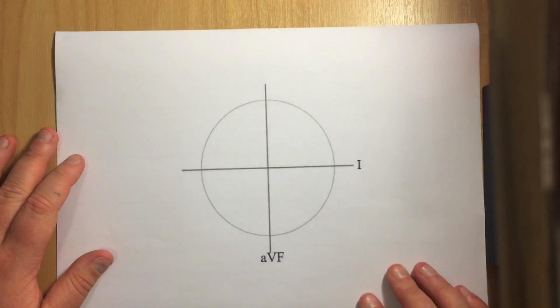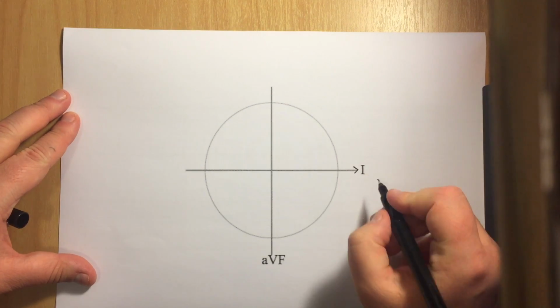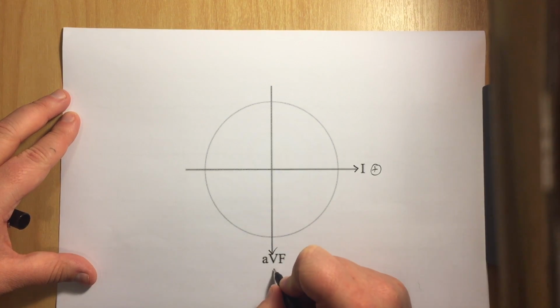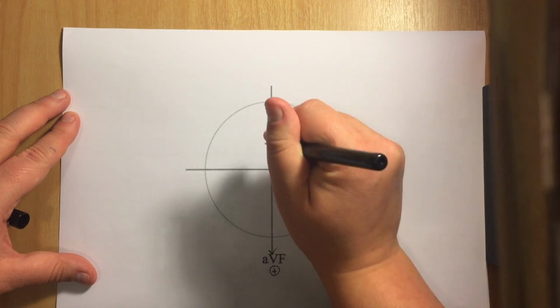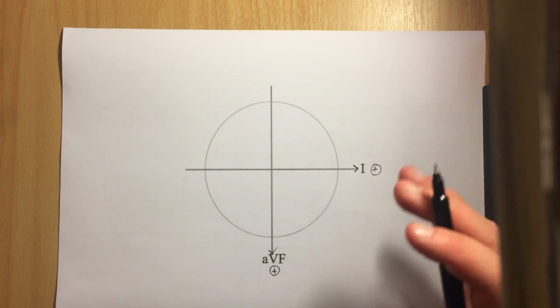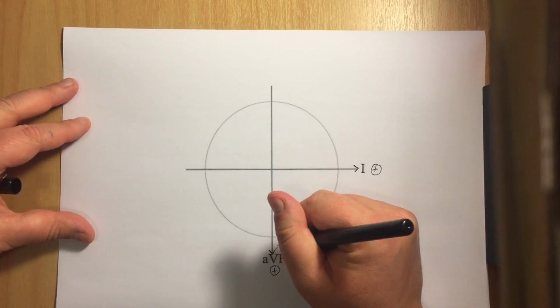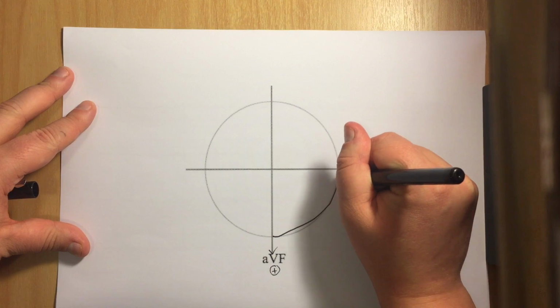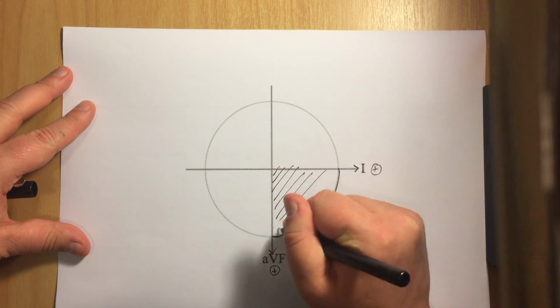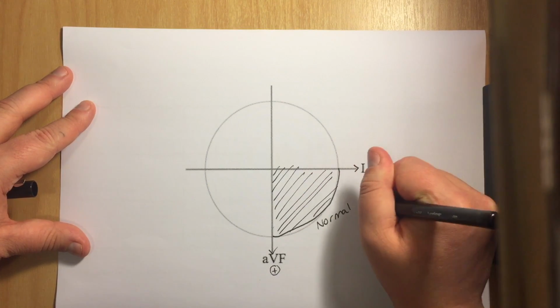So all you need to know for this method is that lead 1, if it's positive, points out this way, and lead AVF, if it's positive, points down this way. So if the biggest deflection of the QRS complex of both 1 and AVF are positive, then your axis has got to fall in this quadrant, which is normal axis.